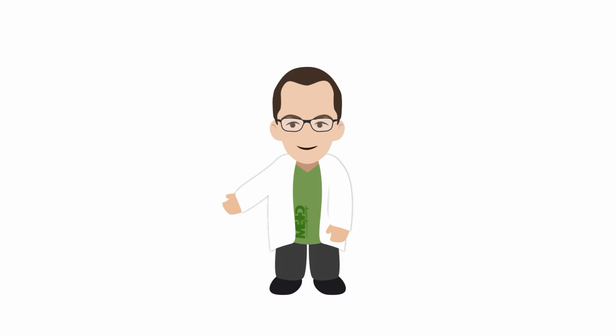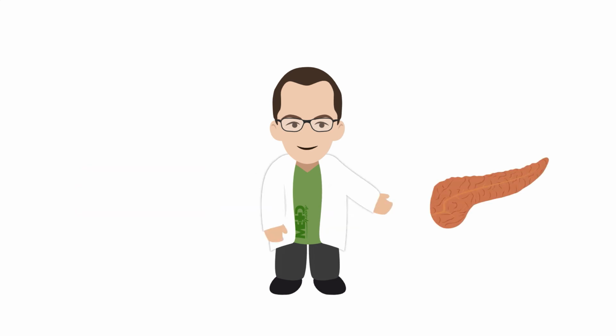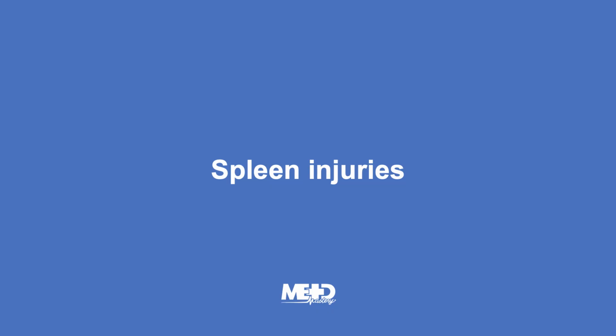In this MedMastery lesson, I'll show you imaging of splenic, liver, and pancreatic injuries. Let's review the most common injured organ in abdominal trauma, the spleen. When the spleen is injured, there is usually some blood around it.